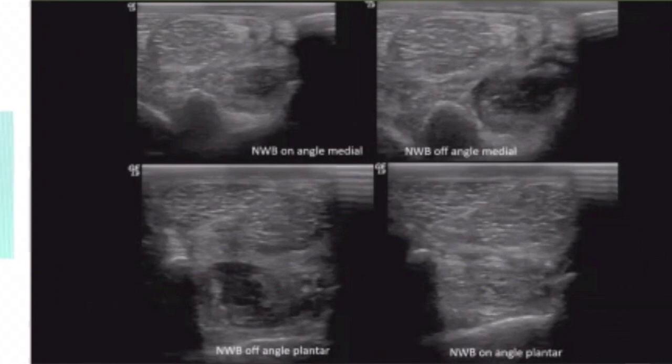And the take home point of this, and what I think is really important, if you get nothing else out of this talk, please take this home. This is not a core lesion. These are an incorrect diagnosis that happens all the time. Horses can get core lesions in their suspensory bodies. They very rarely get them in this proximal suspensory ligament.